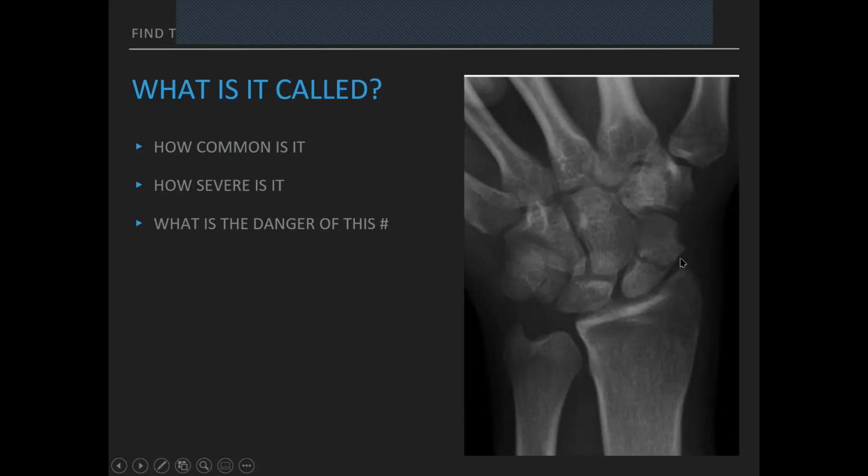All right. How severe is it? It's not that severe, because we're still at this end of the spectrum. Remember, this is the opposite way around compared to the picture that we saw, which was of the right hand. This is of the left hand. So it goes the other way around.